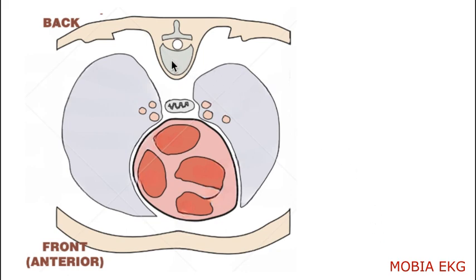Since we see the vertebral column and also the spinal cord in this section, this part will be considered the back or posterior wall of the chest. As a result, on the opposite side, we can find the sternal bone or lower part of the manubrium sterni, with continuation of the anterior section of the ribs.